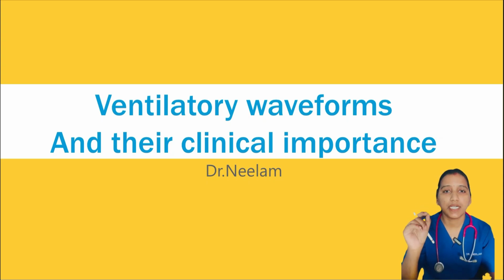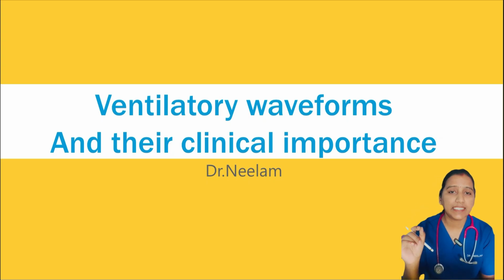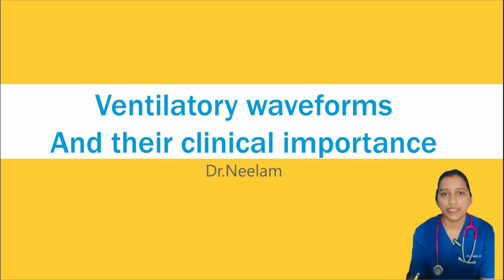Every beep, every curve, and every tiny fluctuation on the ventilator screen tells a story about your patient. But the question is, are you listening to what those waveforms are saying?